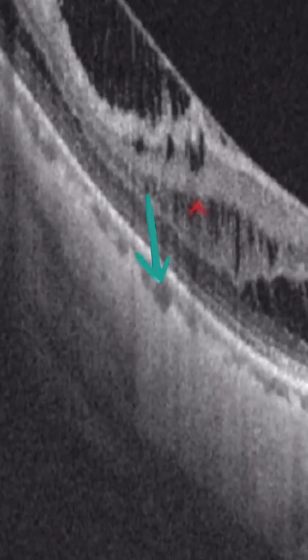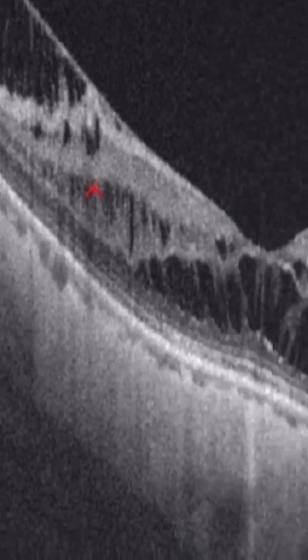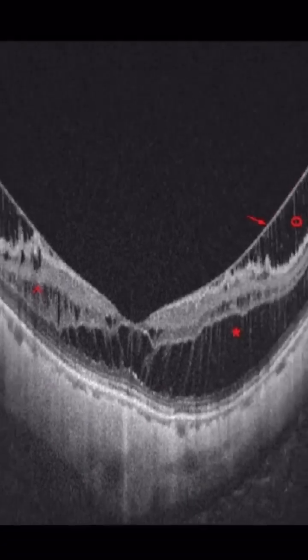This is an example. That's the last thing I look at on an OCT, the choroid. I know there is a lot going on here, but if we just focus on the choroid, you can see that the choroid right here, the dark area just below the RPE, is pretty thin. And some people might think that the white area here is the choroid. Well, in that case, it is not the choroid. In that case, this is the sclera. That's a patient with really high myopia.